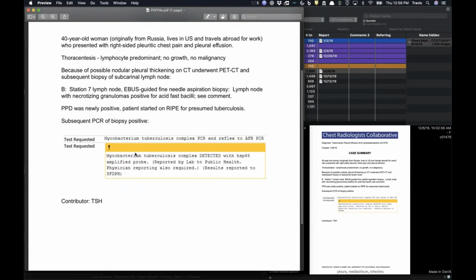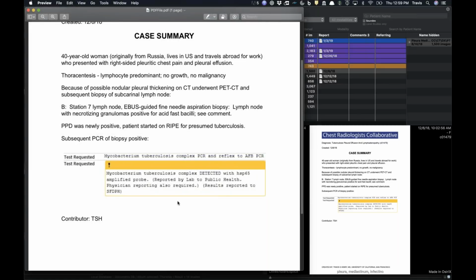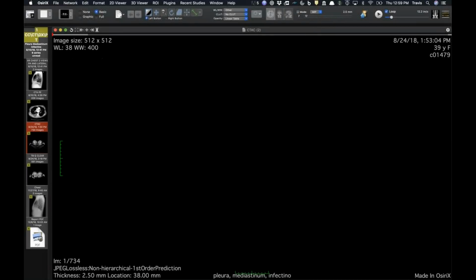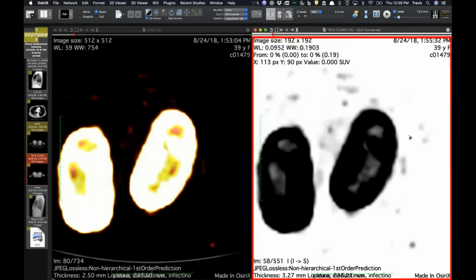You've shown this before. Have I? Yes. No, this was TB. This is not the same one I showed you last week. I showed one exactly like this. There was cryptococcus. I showed you the crypto last week where it was more discrete nodules. So this is actually the second case now I've seen where there's a little bit of nodularity. And they actually did a biopsy of one of the lymph nodes because they thought it was going to be malignant, and it turned out there were necrotizing granulomas, AFB, and it was TB. Oh my word! So no, it looks very much like the one you showed last week. It is, but it's not the same case.